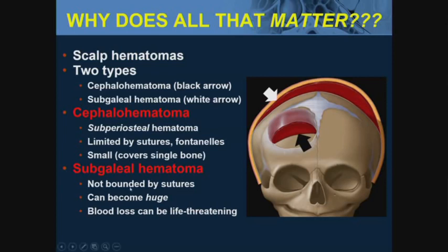Contrast that with a subgaleal hematoma. It's not bounded by sutures, and it can become literally huge. It can extend all the way around the skull, as it does here, and the blood loss, particularly in infants and small children, can literally become life-threatening.